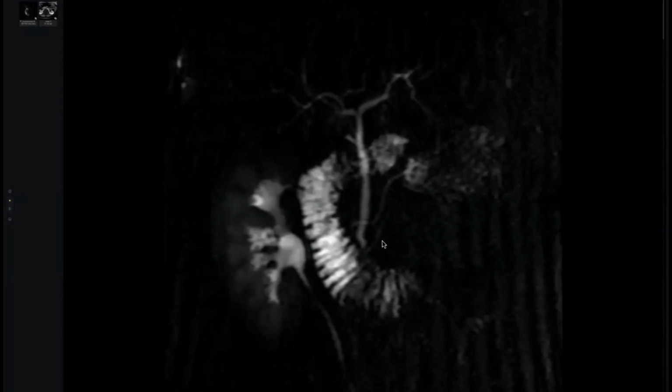Frankly, here, this is the tail, body, neck, then to the minor. Here they are separated, but really the image is not the ideal one.